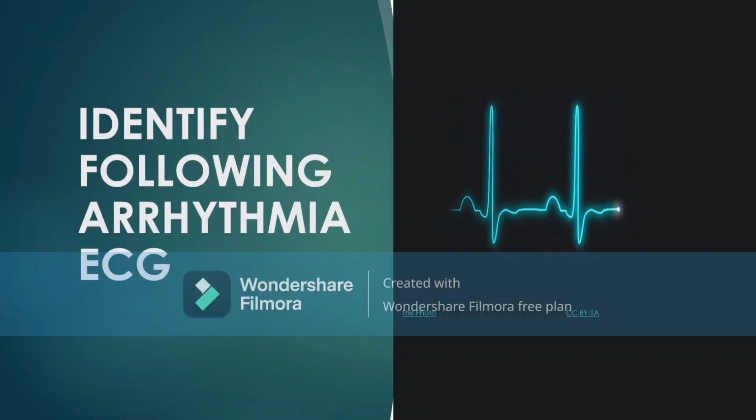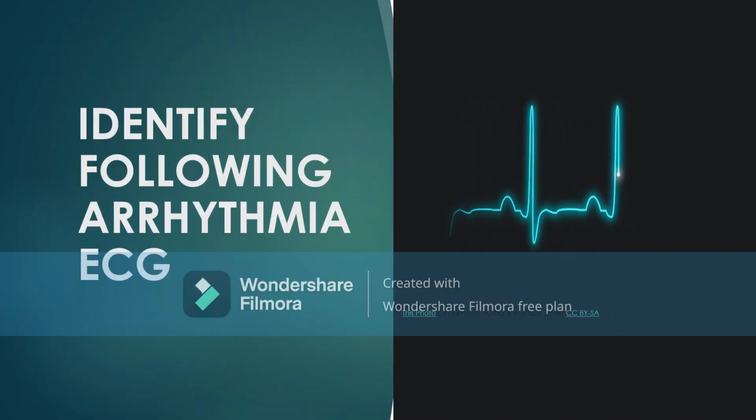Try to identify the following arrhythmias. Later on, we will discuss in detail.